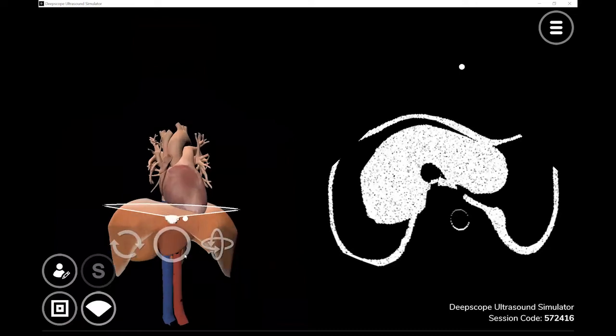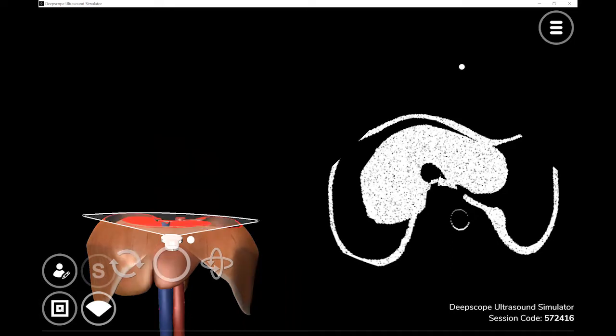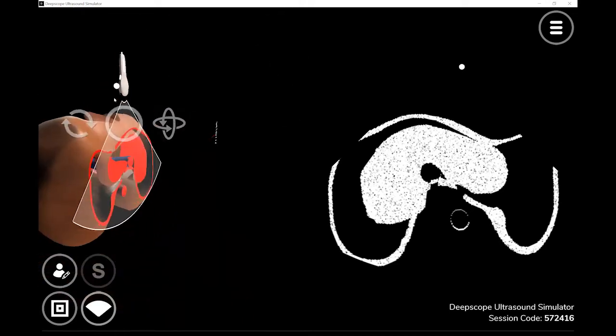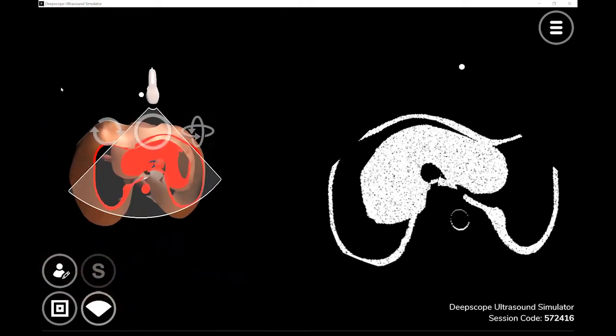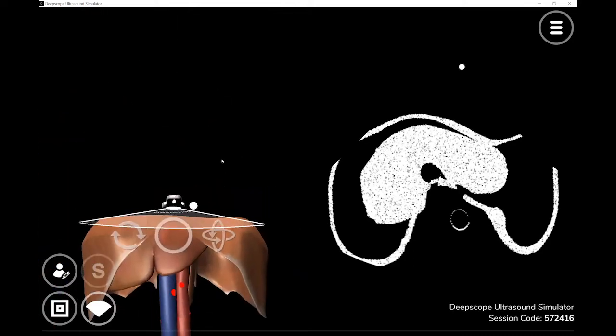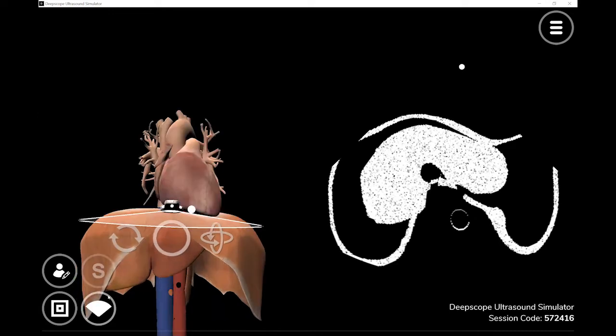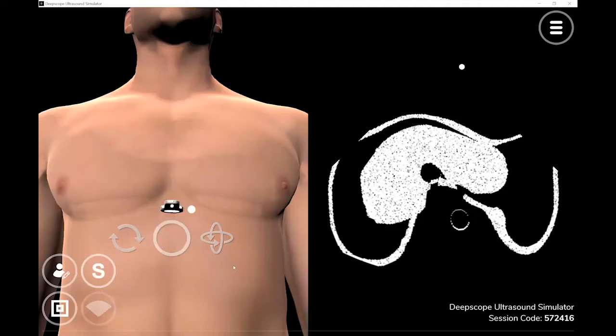I can zoom in so that you can see what's going on a little more clearly with the 3D augmented reality here. I can even cut the slices and it's telling you that this is what we're cutting, perpendicular to the body. I can even rotate this live to see that this is the cut that I'm looking at. So now I can rotate back out. Put this back on, take this out, put the skin in, so I can move this body back.